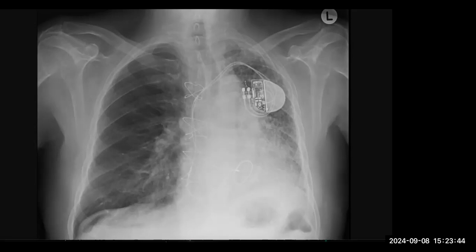relatively preserved. The hila appear normal, so I'm suspecting that this might be a case of, but I do not see any hilar clips, any evidence of clips on the right hilum to suggest any post-operative changes. But it could be a case of lung transplantation. It could be a case of previous lung disease with unilateral lung transplantation, seeing that the findings are predominant in the left side, or there could be some unilateral fibrosis.